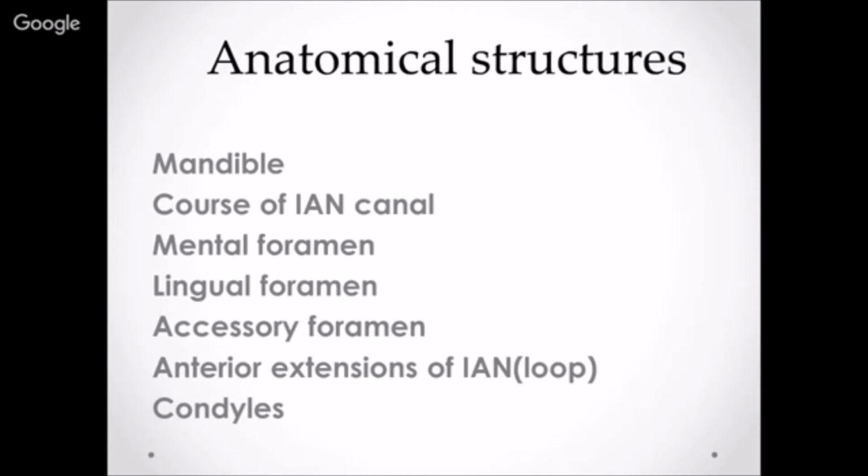Condyles may not have any kind of relevance to implant imaging, but when you do mandible scans, certain large field of view mandible scans, you might end up with a little bit of condyle. So it is imperative, for the sake of completeness, to go ahead and actually evaluate the condyles as well.